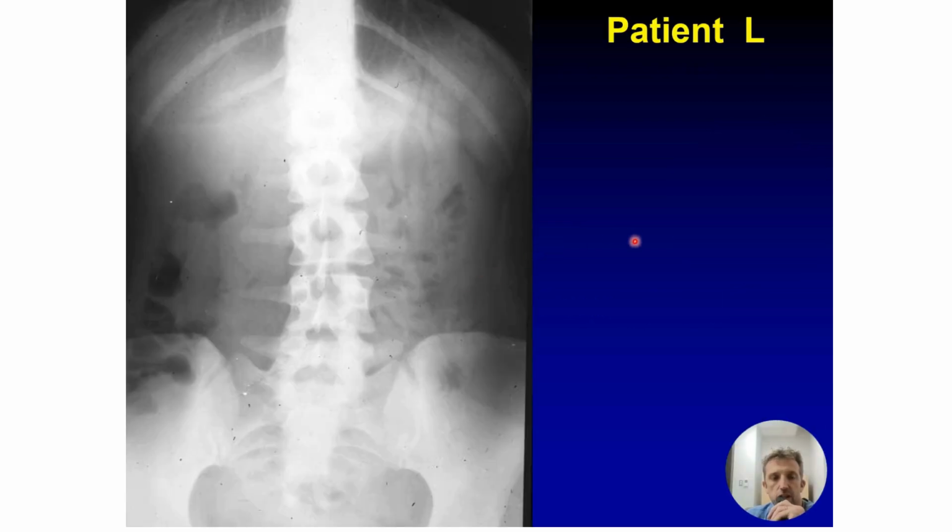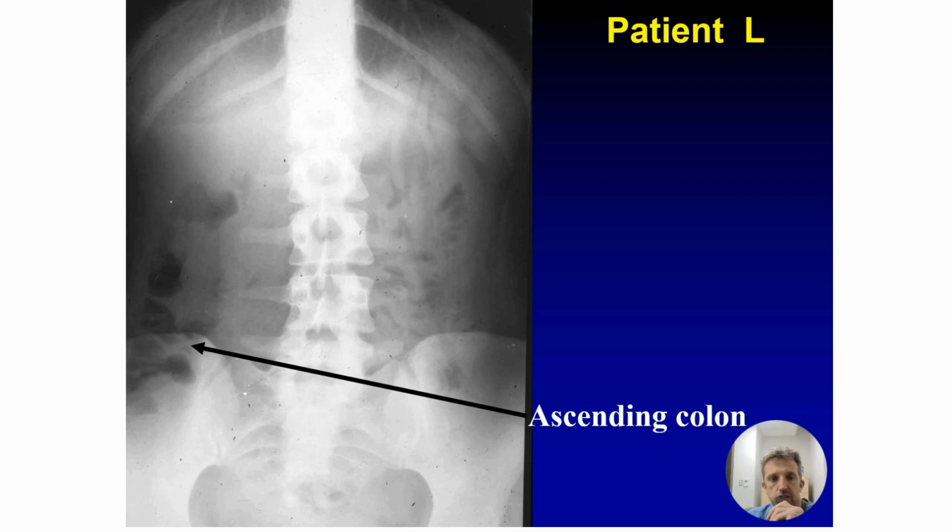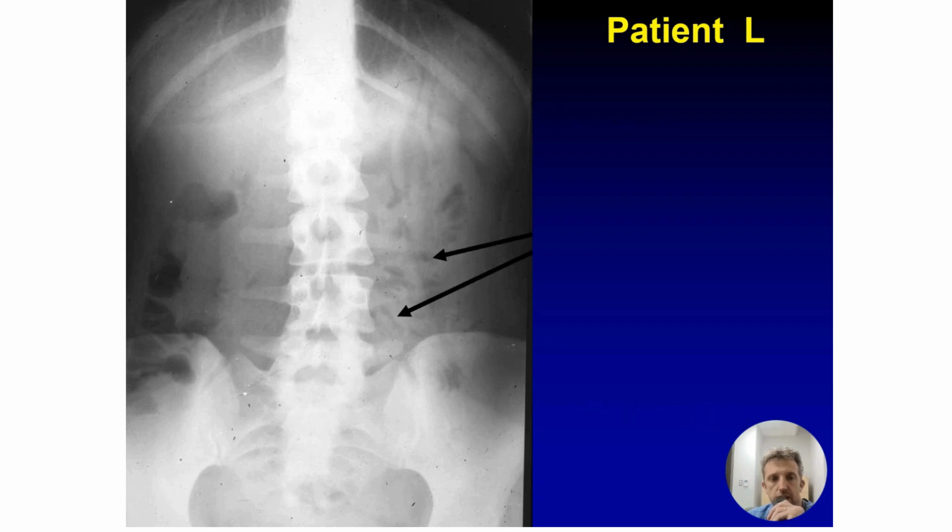Okay, so let's start with this radiograph. Stones, bones, mass, and gas. I don't see any lines or tubes. Bones look okay. No mass or mass effect. And bowel gas, we've got the colon on the outside, small bowel on the inside, a little bit of distal gas. This is normal. And free air, is there free air? Well, we have to know how to look for free air first. So let's learn. There's our ascending colon, stomach.